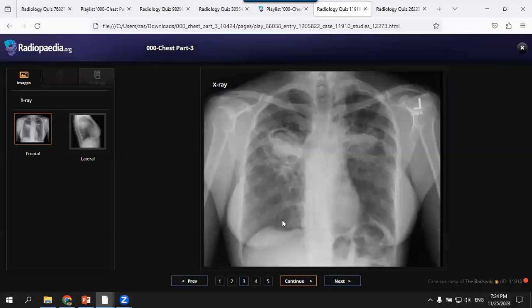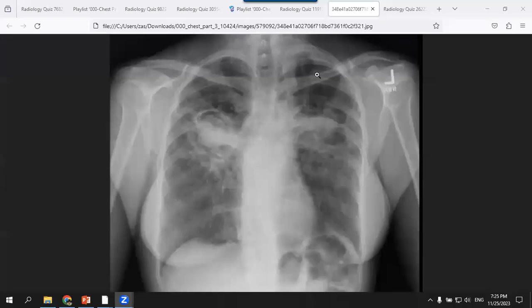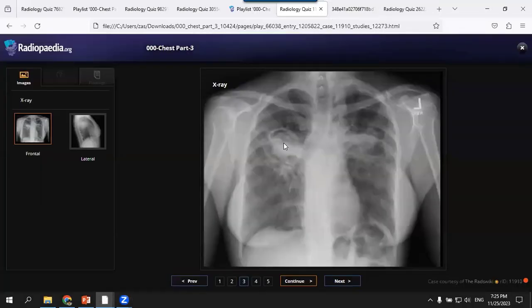Can you describe this one? There are bilateral central masses, and on the right side there is a crescentic lucency. So I'm suspecting that could be progressive massive fibrosis with cavitation, with maybe superadded aspergillosis. Very good. I would like to evaluate with high resolution CT and compare with previous. What other etiologies may predispose to aspergilloma infection?